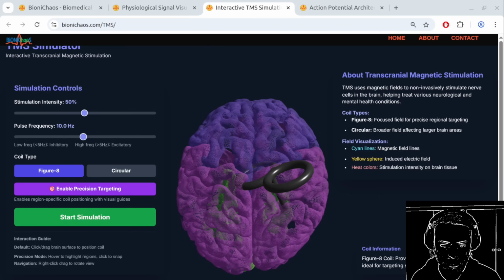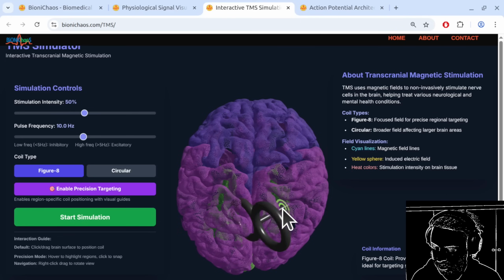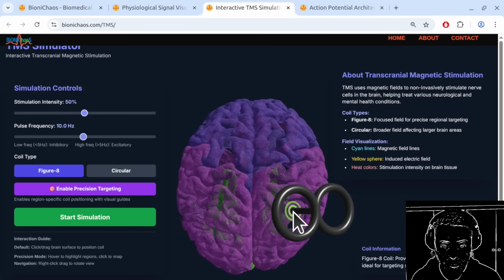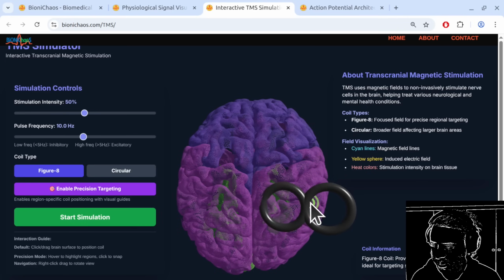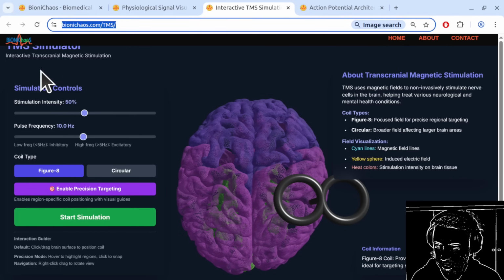I know lots of people are interested in the technical details. We are not. We're interested in the web application actually working. And we are developing in English. So the question about what code you use, well, obviously it's JavaScript, because it's available for you on the site. You can go check it out straight away.